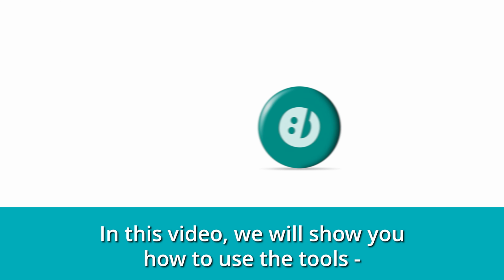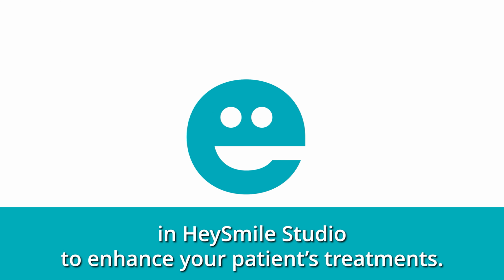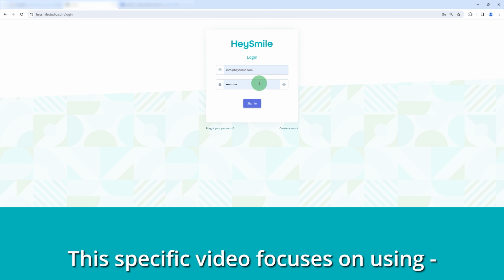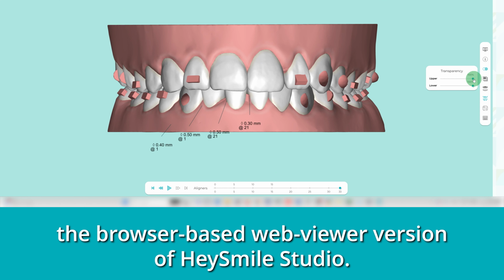In this video, we will show you how to use the tools in the HeySmile Studio to enhance your patient's treatments. This specific video focuses on using the browser-based web viewer version of HeySmile Studio. All right, let's dive in.